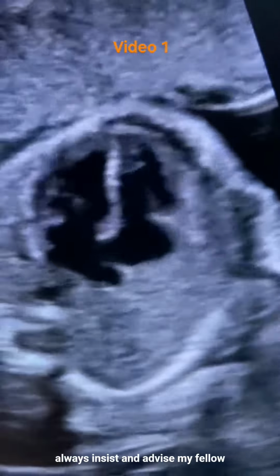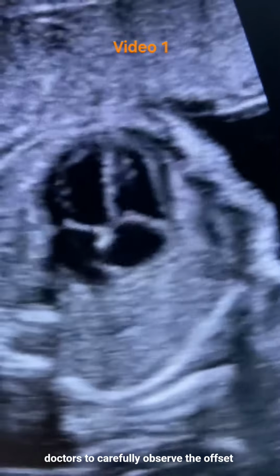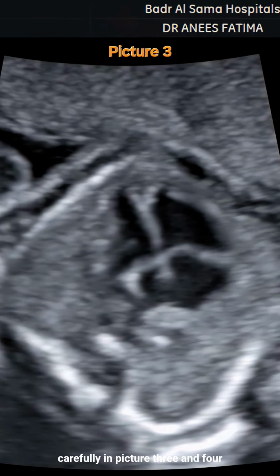I always insist and advise my fellow doctors to carefully observe the offset appearance of the valves. In picture 2, the valves are clearly in a straight line, which cannot be missed. But if you observe very carefully in picture 3 and 4, you will notice that the loss of the offset appearance is subtle but present.